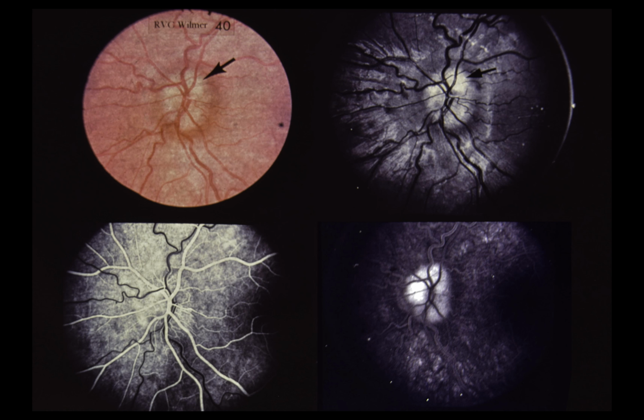The right optic disc has a similar appearance. Upper right. In this red-free photograph, normal nerve fiber layer striations are seen despite elevation of the disc, and an arrow points to a small mass at the superior disc margin. Lower left. 15 seconds after fluorescein injection, disc capillaries have an abnormal branching pattern but do not leak. Lower right. 30 minutes after injection, late hyperfluorescence in a scalloped pattern typical of drusen is present.